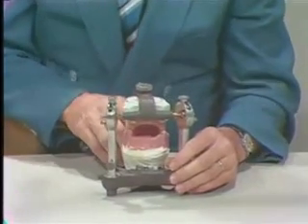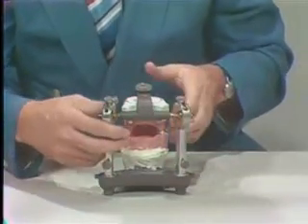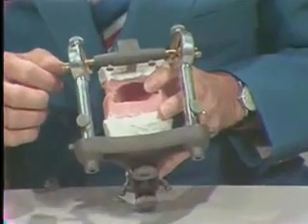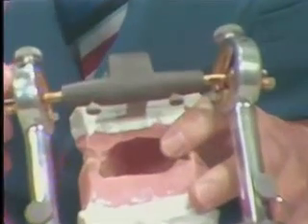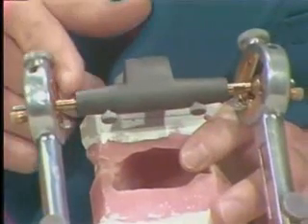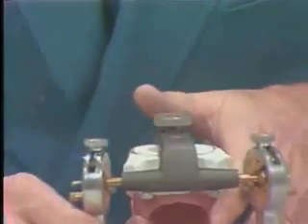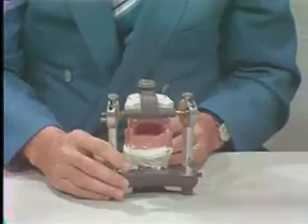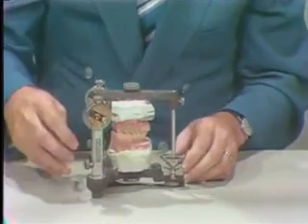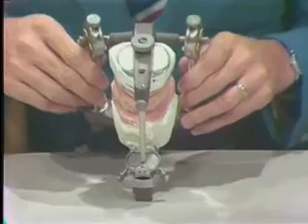Now if your incisal table is not centered, you'll find two little screws in the back, and these are lock screws, and they should be loosened. Then by taking a wrench on this flat spot you should adjust that until your incisal pin is centered both in an anterior-posterior direction and also laterally, so that the pin sets in this manner.